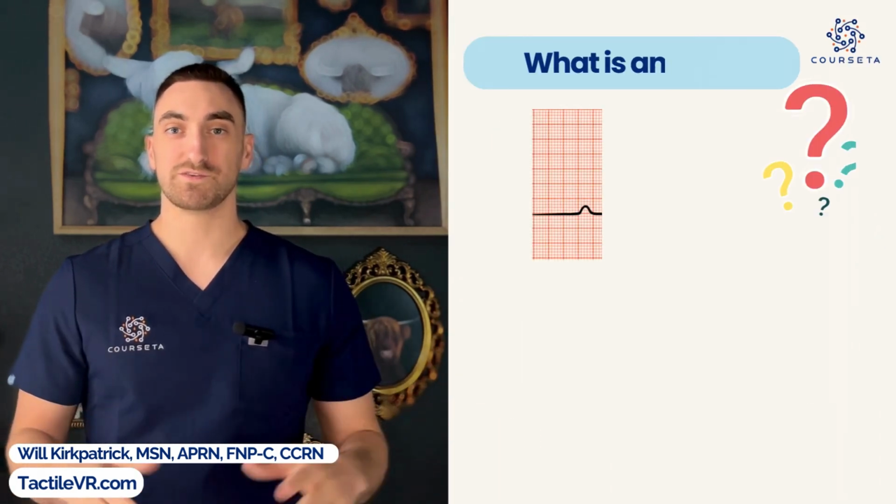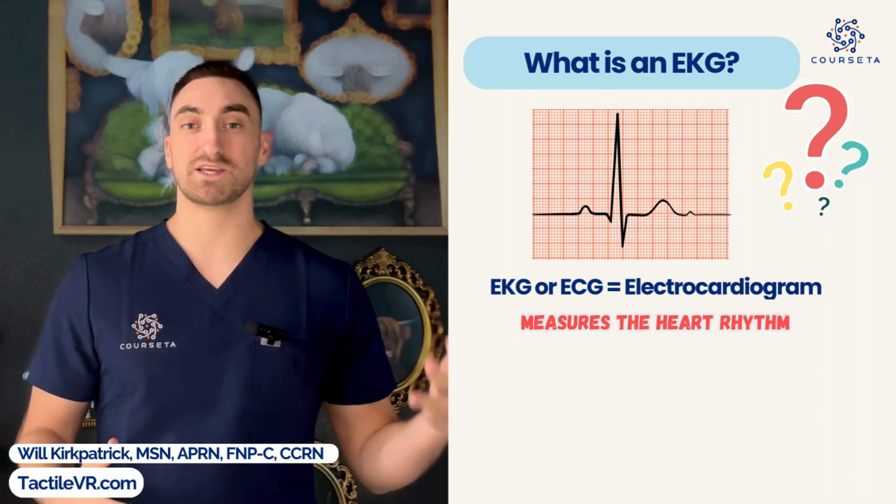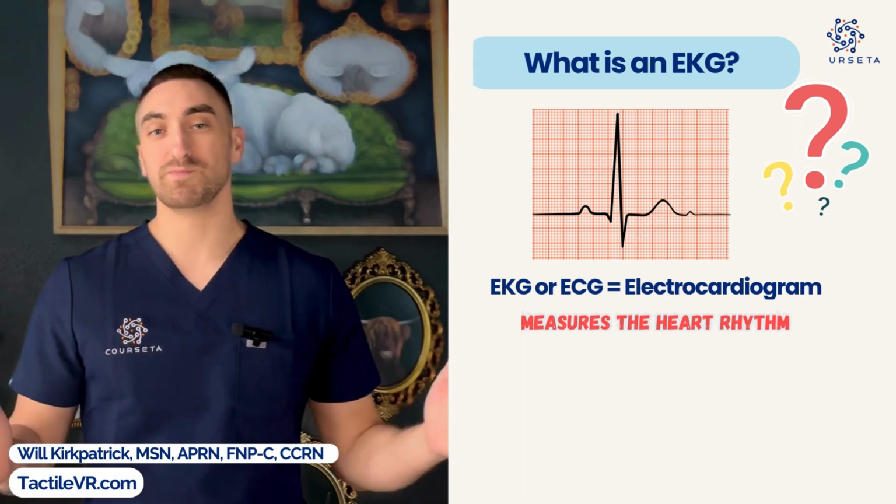So first of all, what is an EKG? An EKG is an electrocardiogram that we use to assess a patient's rhythm. You may see it as EKG or ECG. They both mean the same thing.